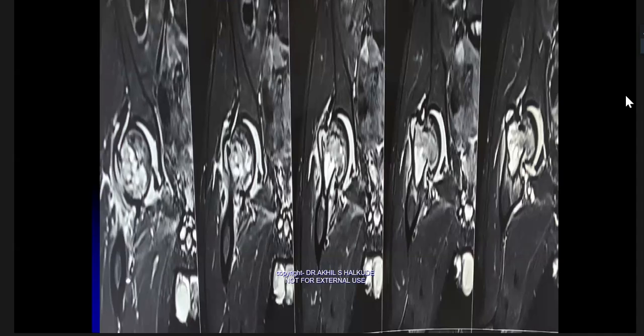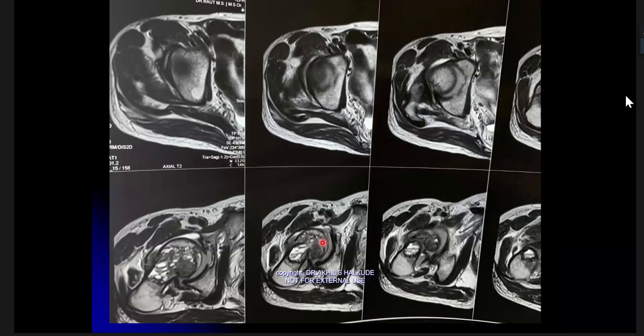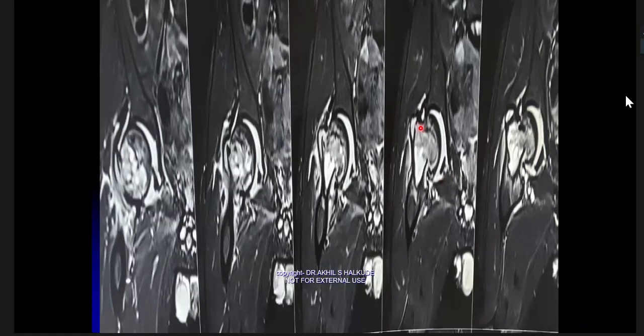If you see the last image, it is a blackish lesion, a T2 hypointense, well-defined rounded lesion in the subarticular region of the femoral head and neck. The major part of the lesion is blackish, and multiple fluid levels, as you described, are present. We can easily say there is a fracture due to this. So basically, this is a pathological fracture.